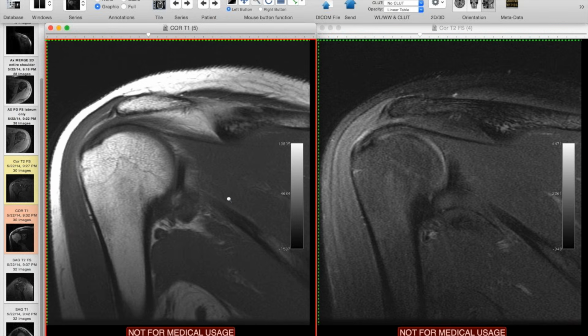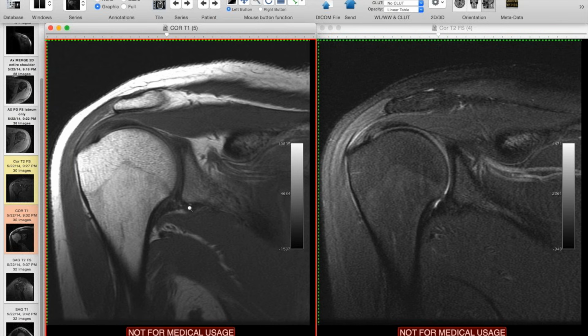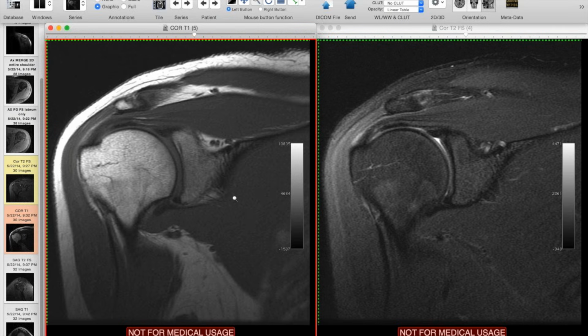It's also good to realize that you don't necessarily have to have a cystic mass lesion in the quadrilateral space to have that syndrome. You may have prior injury to the anterior or inferior capsule that causes some fibrosis and sort of indirectly or secondarily affects the quadrilateral space.